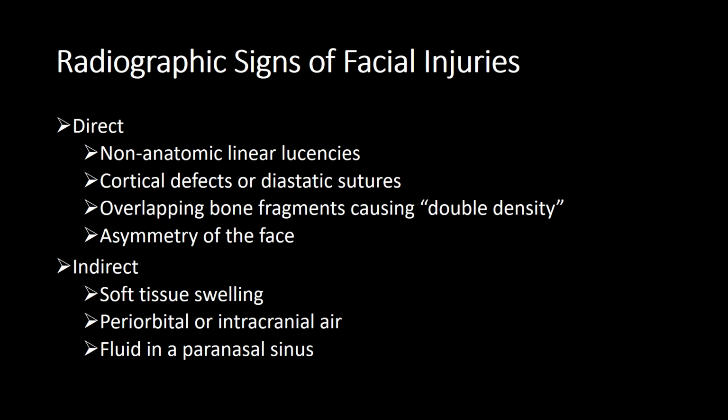So indirect signs include soft tissue swelling. Remember, be careful, don't mistake the eyelids in particular and the soft tissues of the cheek for periorbital swelling. Look for periorbital or intracranial air, and check for fluid in the paranasal sinuses.